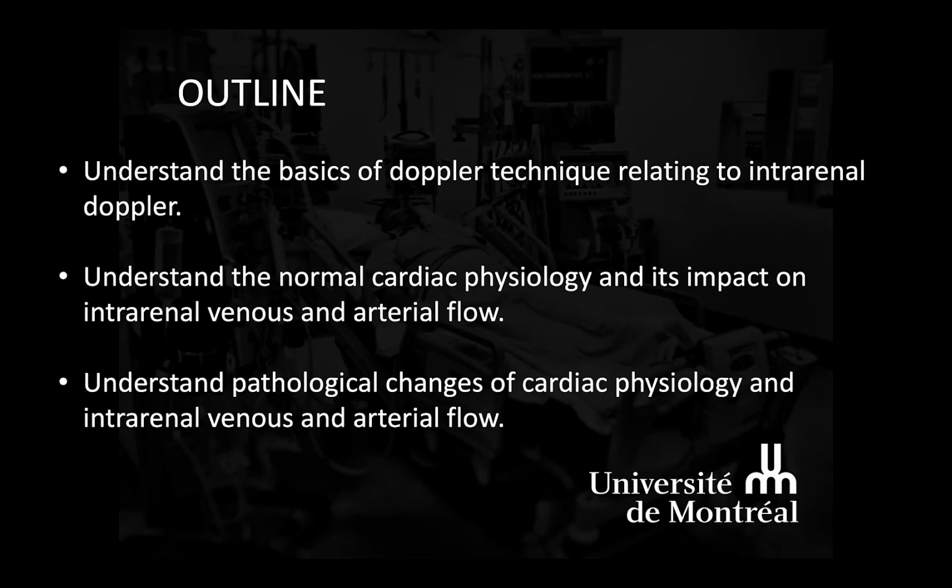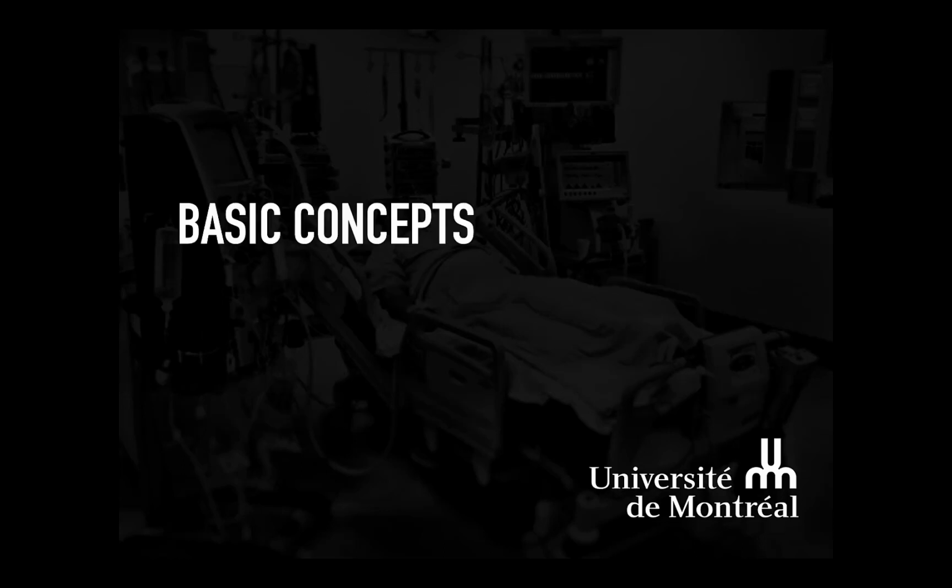One point that needs to be stressed early on is that the domain of intrarenal Doppler, particularly in the venous profiles, is progressing rapidly. As such, this topic is dynamic and subject to change. We will start with some basic technical and physiological concepts necessary for proper understanding of the assessment.